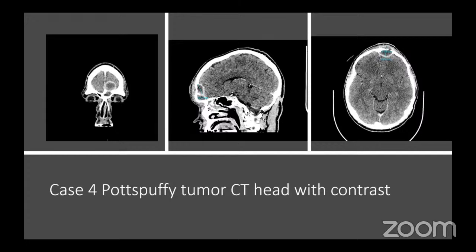As you would see, the frontal sinus drainage pathway is completely blocked, and therefore external trephination was carried out and pus was drained, and a corrugated drain was left in situ for a couple of days until the drainage was minimal.